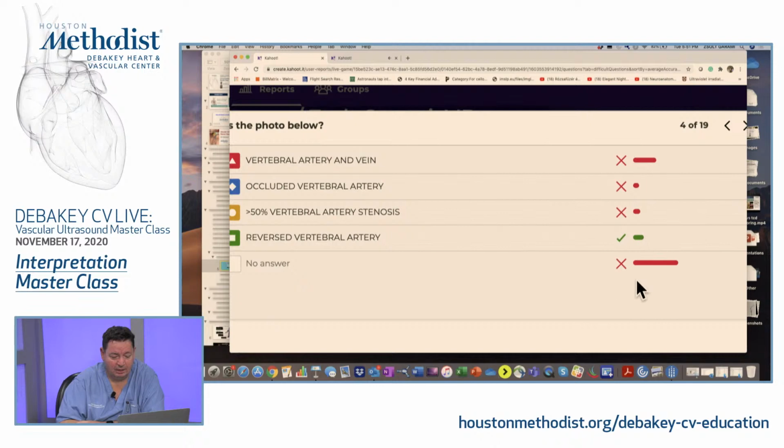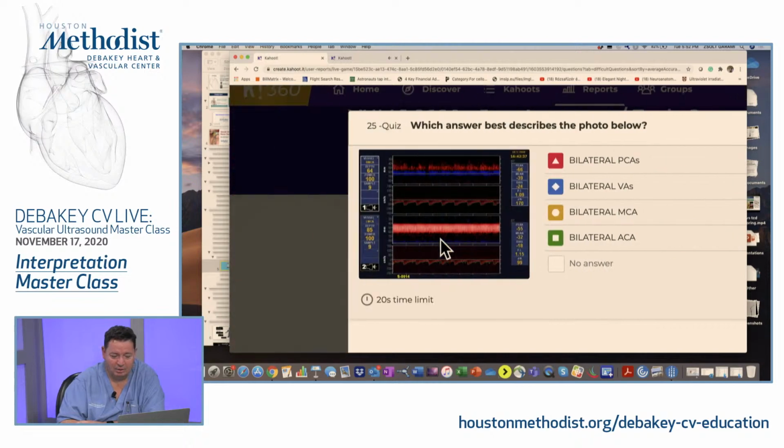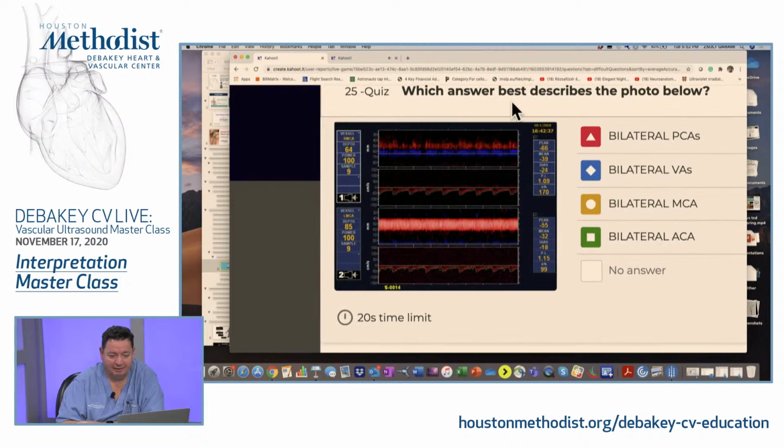those people in my training session did not even dare to answer. So I think this is why it's worth teaching with these waveforms, when you look at how many wrong answers we get on these certain beautiful pictures.